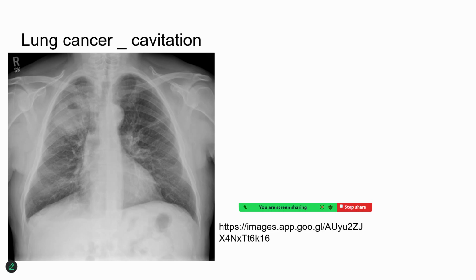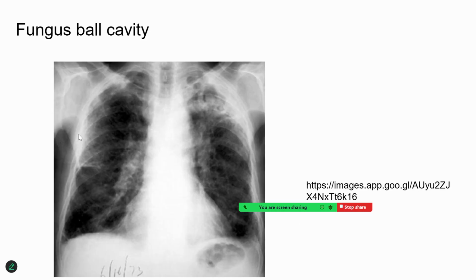A primary cancer of the lung may also become cavitated, which usually presents as a hard mass, and then there is necrosis. A typical cancerous mass of the lung tissue would have an irregular border and an irregular, patchy appearance, and that's how it is seen in such conditions.